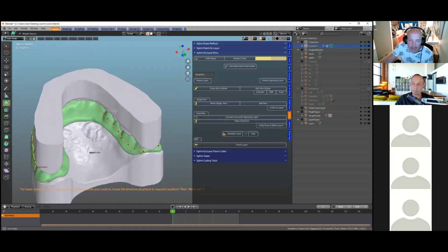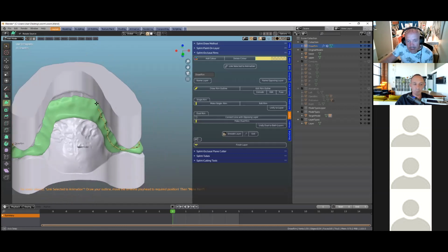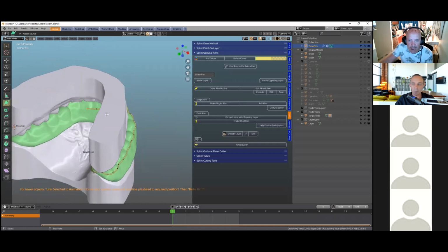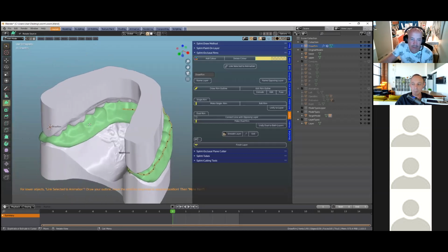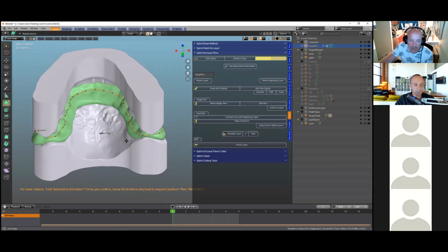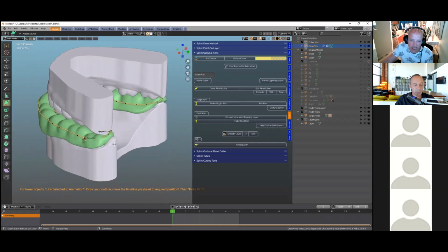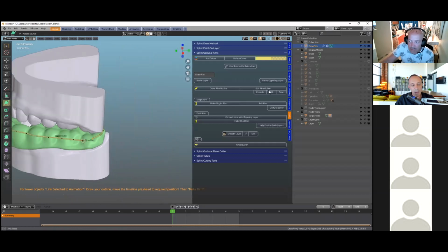And the reason I did that is because we don't want to duplicate the entire module for the upper and lower rim. So we can just pull it up, so it extrudes in the Z direction. Instead of redoing the whole model with an upper and a lower, we just stick to one menu and just pull it up.